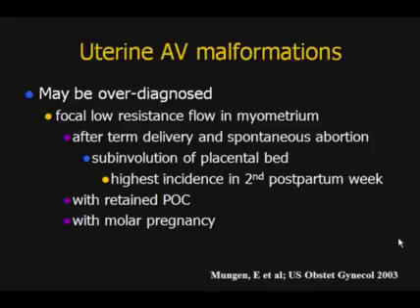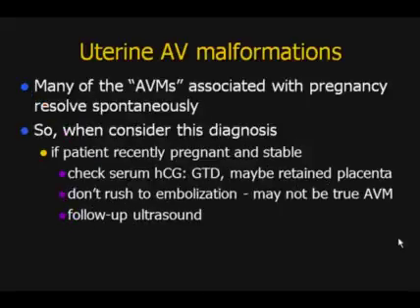Now you can also see this focal low resistance flow with retained products of conception or even with a molar pregnancy. What we're recognizing is that many of the so-called AVMs, what sometimes have been diagnosed as AVMs in the postpartum period, actually resolve spontaneously. So it's important not to overdiagnose these, not to rush off to treat them with embolization.